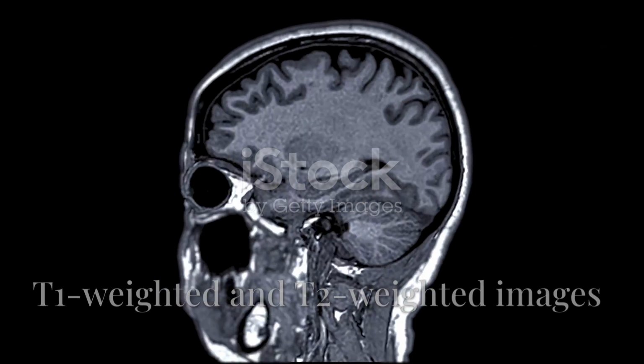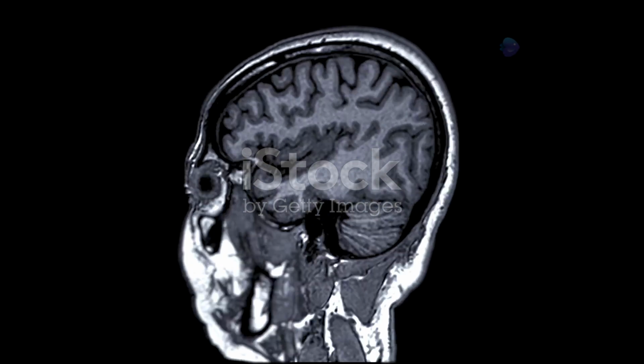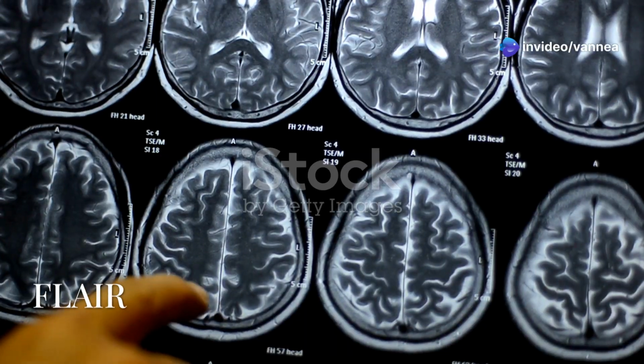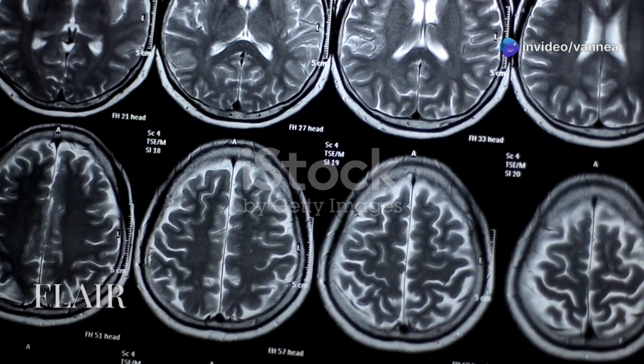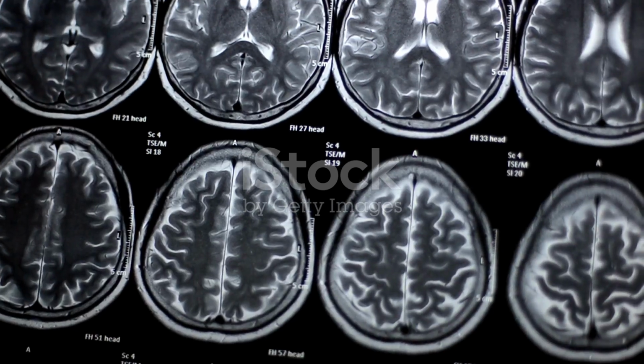Now let's focus on T1-weighted and T2-weighted images. These are the two most fundamental MRI sequences, and each provides unique information about tissue characteristics. FLAIR is especially useful for detecting lesions such as multiple sclerosis plaques.